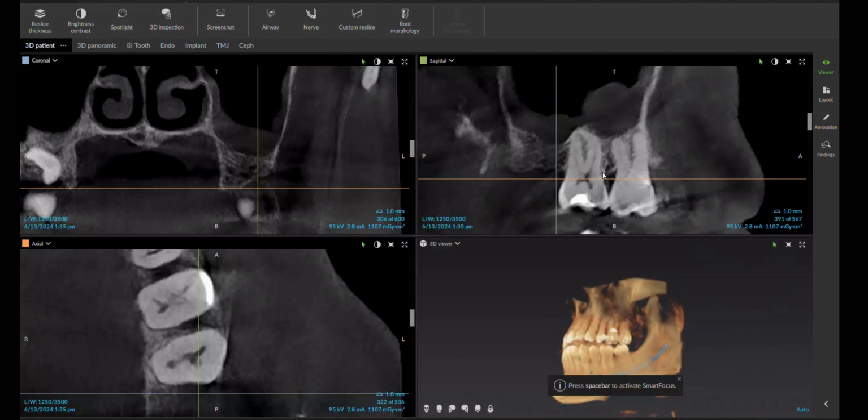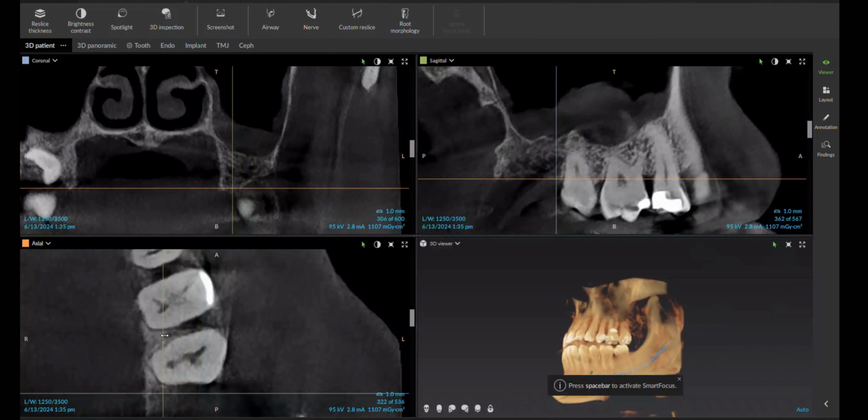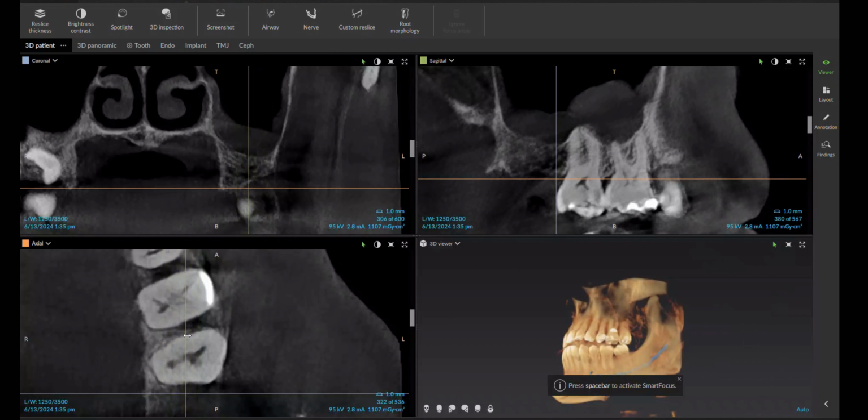Let's come out of that. Sagittal view. What I'm going to do is look for the color of the line that's not in this pane. That tells me that's the line that I'm looking at. So I don't see green here. If I come over here and grab the green line, I'm going to see that upper right pane move. Again, the line that's not represented in the pane is the line that's representing the two-dimensional image from the other two-dimensional images. So you see two green lines here. You don't see the green line here. This is just basic CAT scan analysis.